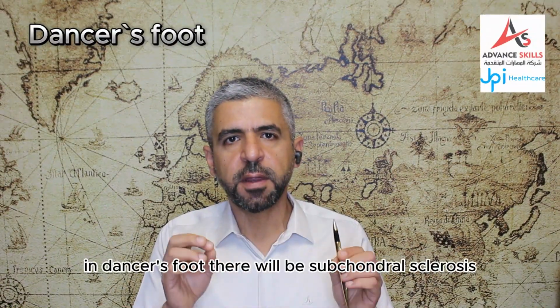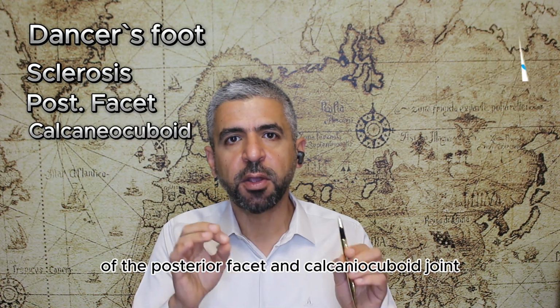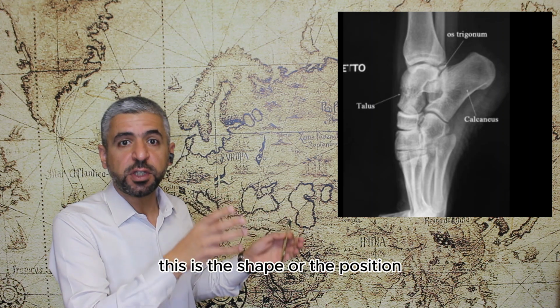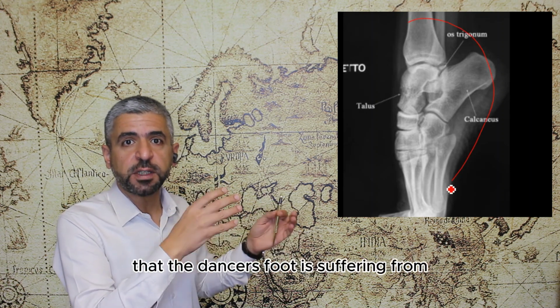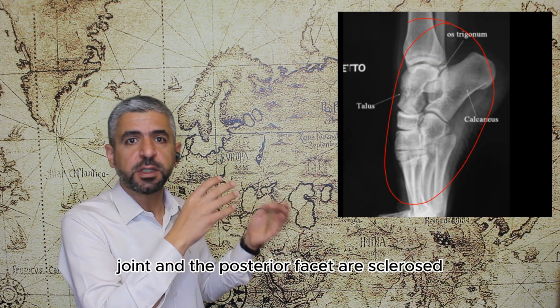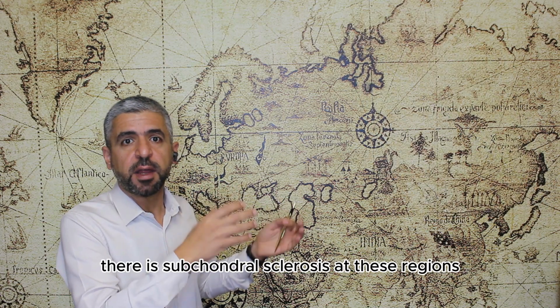In dancer's foot, there will be subchondral sclerosis of the posterior facet and calcaneocuboid joint. Like we can see here in this X-ray, this is the shape or the position that the dancer's foot is suffering from, and you can see the calcaneocuboid joint and the posterior facet are sclerosed. There is subchondral sclerosis at these regions.